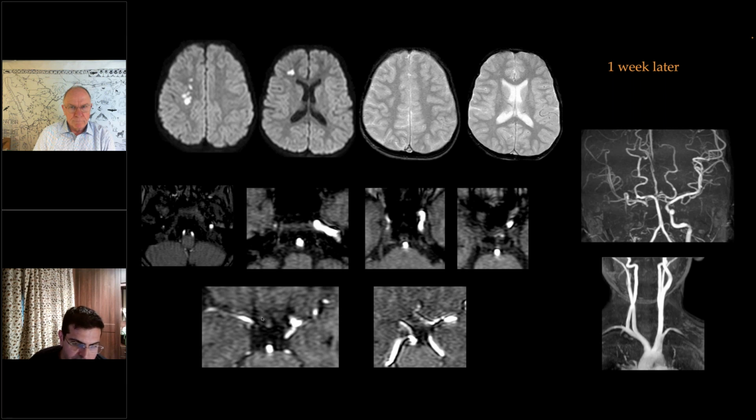Nihaal, at what level does the internal carotid occlude? I'm trying to figure that out on the right side. It's from C5 to C7. In the report they mentioned from C1 itself, the cervical part. Complete occlusion, not the narrowing? But there is a narrowing right from C1, yeah.